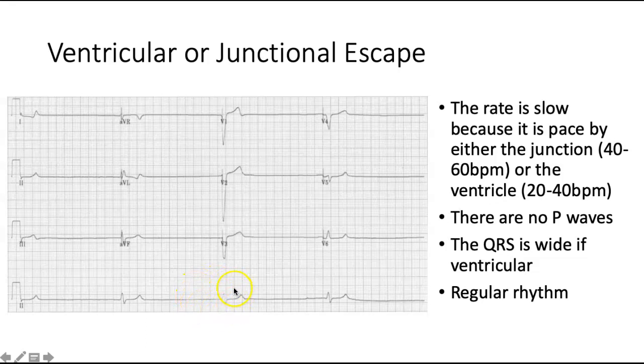So this is a very slow junctional rhythm. And what it's meaning is the SA node is not firing, and then the junction or the ventricle kicks in.